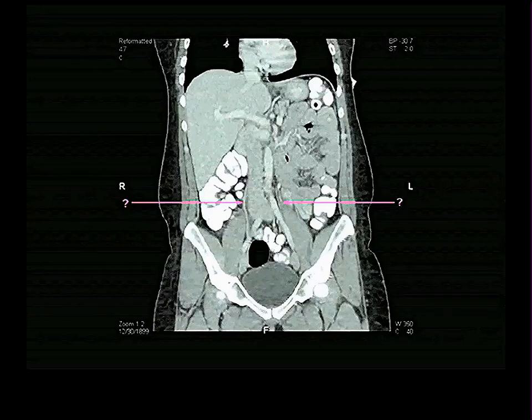It has intravascular contrast, which is derived from the fact that it branched from the aorta. So I was right, but I never gave any thought as to why I was right. This is known as problem-solving anatomy. So these really are the gonadal vessels, or the ovarian vessels in this woman.